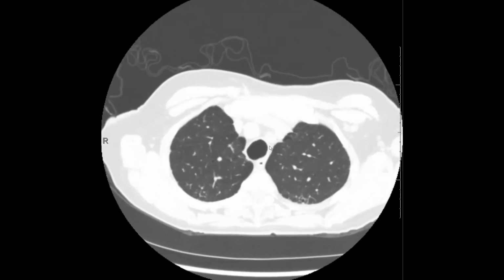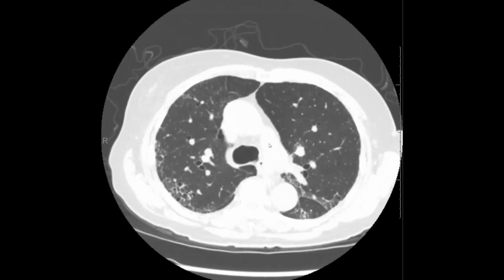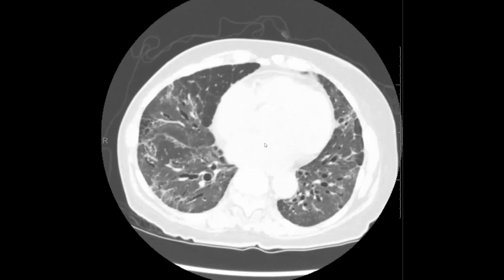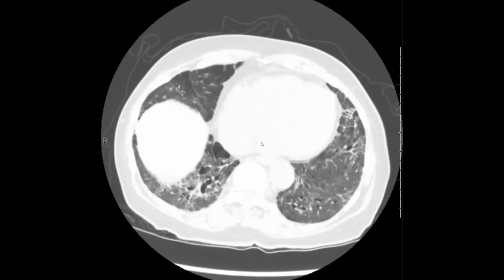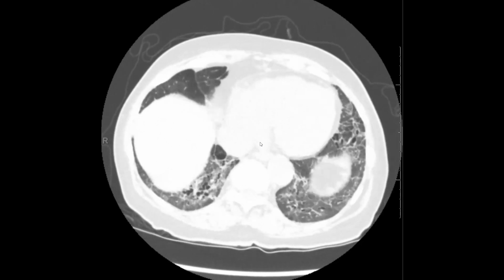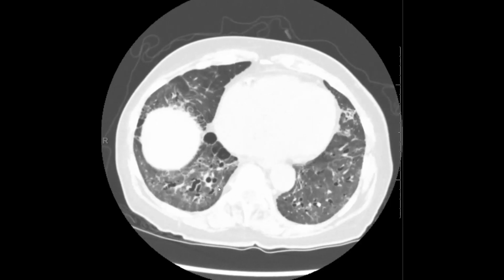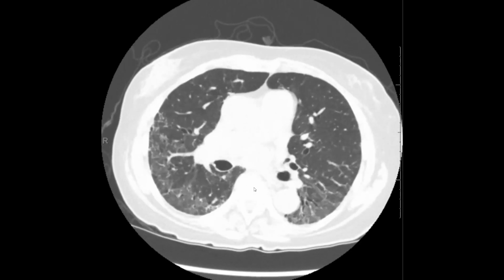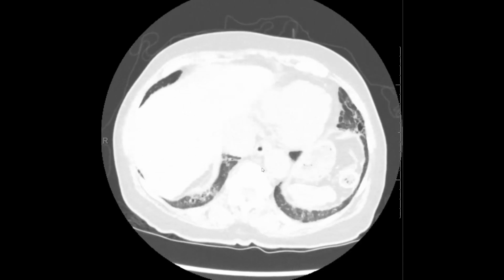So overall, what is this pattern doing? Initially, it was an NSIP organized pneumonia pattern, which then evolved into more of a fibrotic NSIP pattern. And now it's sort of in flux. It's evolving from NSIP into UIP. And UIP, as you guys probably know, really represents end-stage pulmonary fibrosis. So there are many different conditions which can evolve into a UIP pattern. And so this looks like it's starting to move in that direction. Though, again, note this beautiful traction bronchiectasis that implies that this emanated from an NSIP pattern, if you had perhaps just this single CT to examine and evaluate.